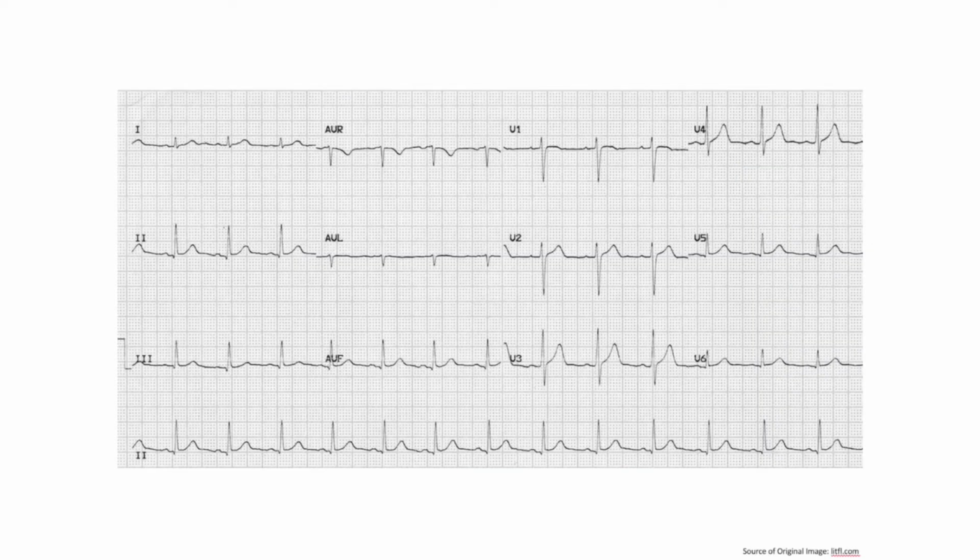In the prior session, we talked about the different waves in an EKG. When it's printed on a piece of paper, it would be awesome if there were an easy way for us to look at how long the duration of a wave was, how the shape of the wave changed over time, and also how strong a specific wave was. To help us with this, we have the EKG paper that you can see in the background.